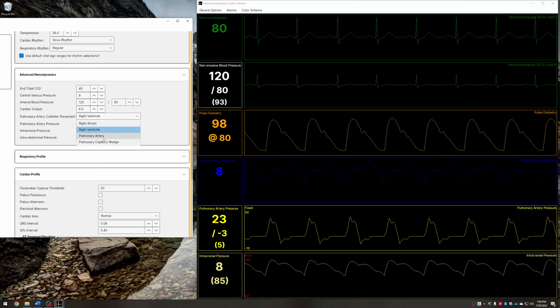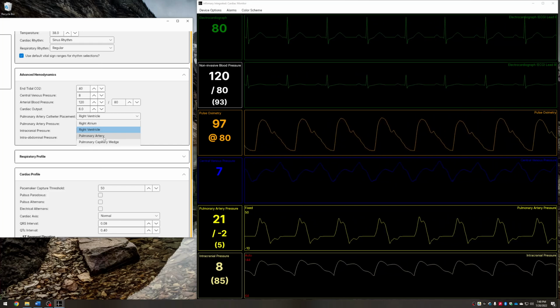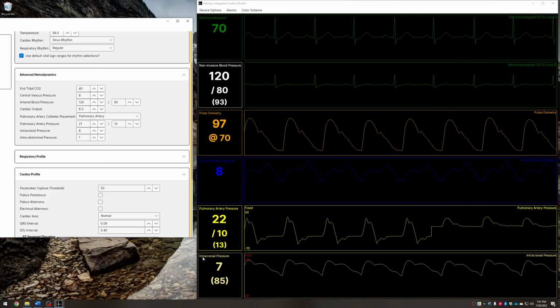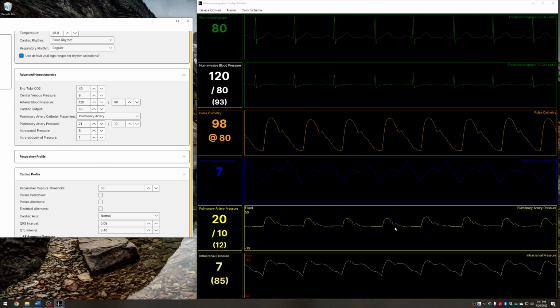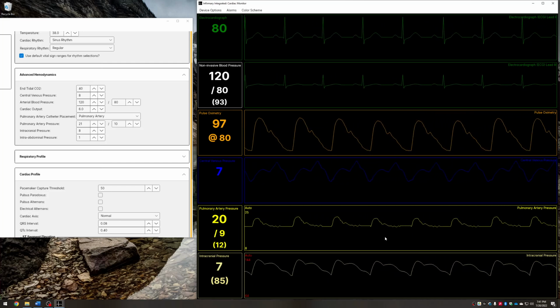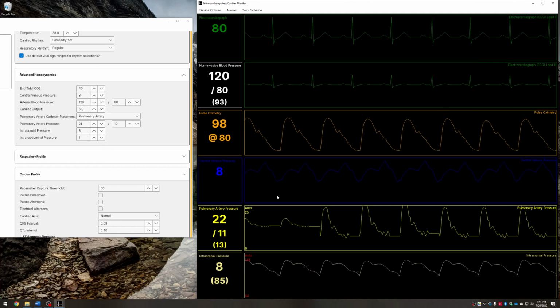And as I proceed into the pulmonary artery, I'm going to then see the typical or the standard PA pressure waveform. And having changed that, it did adjust the PA diastolic pressure to a normal pressure. And now we see that the waveform has also changed. And I can toggle auto scaling, and we will also see this auto scale for a larger tracing, a larger drawing.